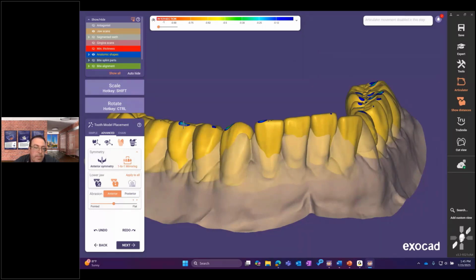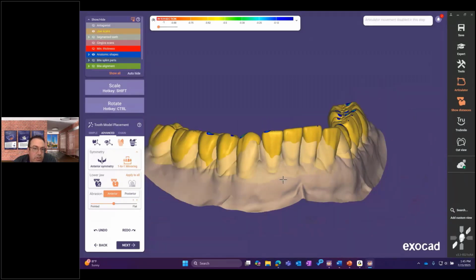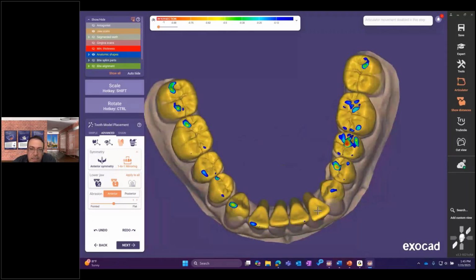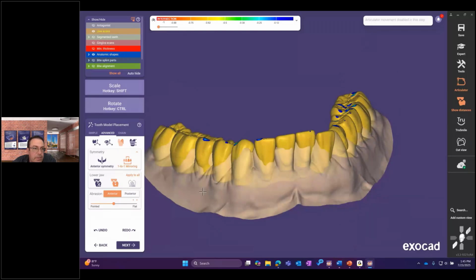That's probably one of my favorite new features. That's huge with tooth placement. Yeah. It's pretty neat once you get used to it. So just some more tools to add to the arsenal here for speeding up and making it a little more flexible for these big tooth setups.